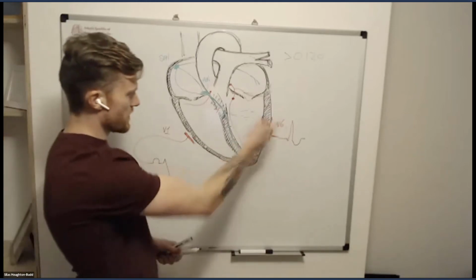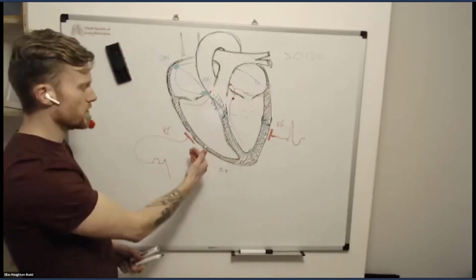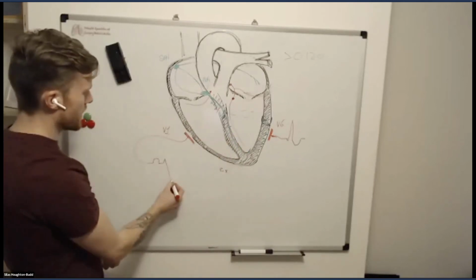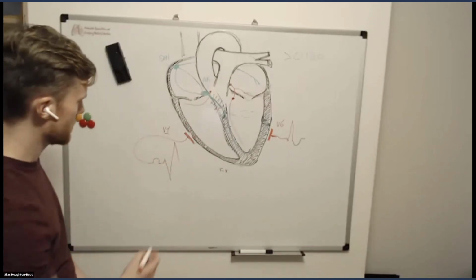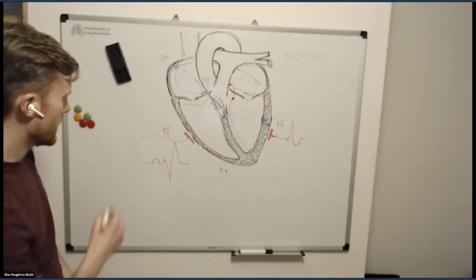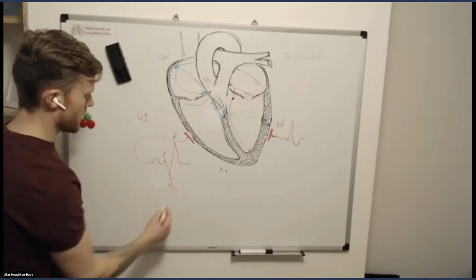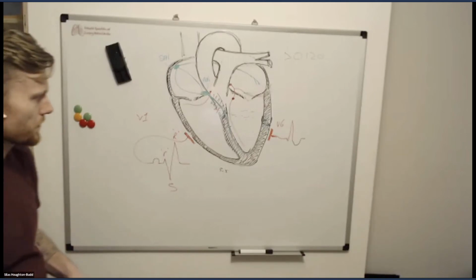And so similar to V6, once that finishes happening, the right ventricle, which is taking a while to contract because of the cell-to-cell conduction, is still traveling overall with a net direction towards the electrode. And so we get a big broad R wave that occurs in lead V1 prior to meeting the isoelectric line. People recognize this classic pattern of a small R, a big R in lead V1, and a big S. That RSR pattern in V1 is fairly classic of a right bundle branch block.